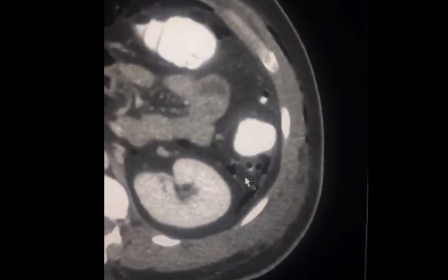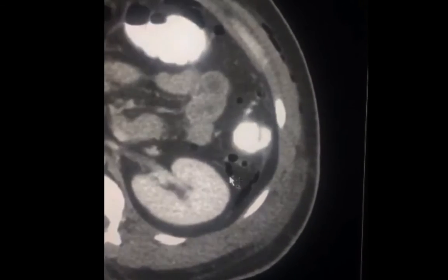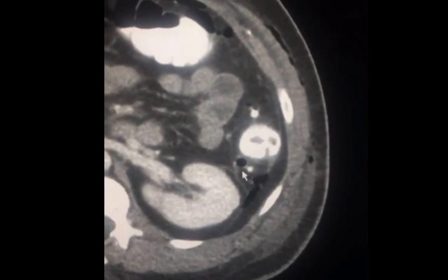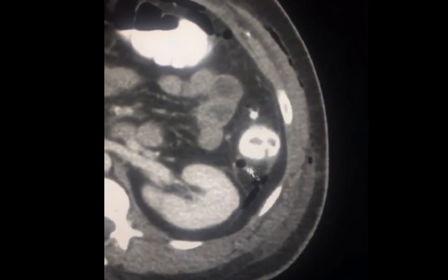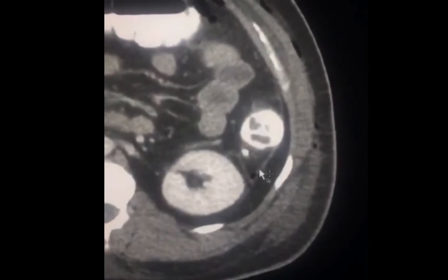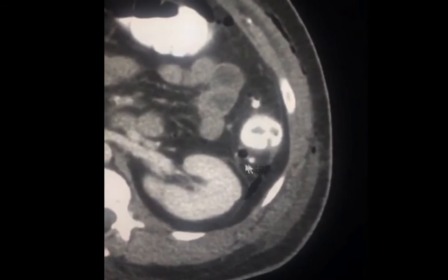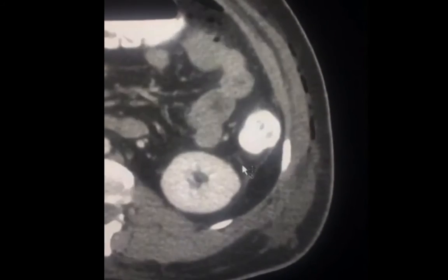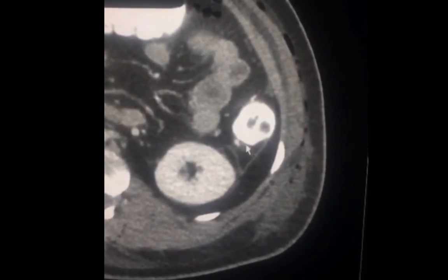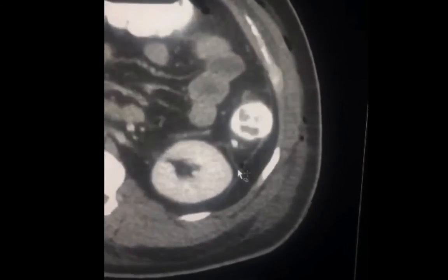Closer inspection of the area surrounding the left-sided colon shows that it's not only free air that's seen in this location. There is adjacent hyperdensity, which is equivalent to the density of enteric contrast. Such a finding confirms perforation with extraluminal leak of enteric contrast within the retroperitoneal space. And by scrolling slowly, you'll notice that the area of perforation arises from the posterior wall of the descending colon.